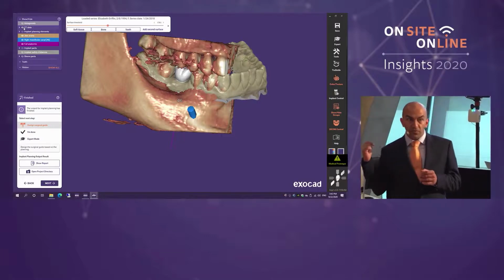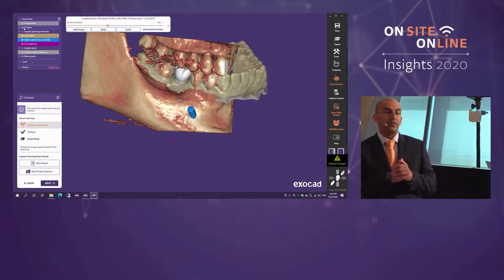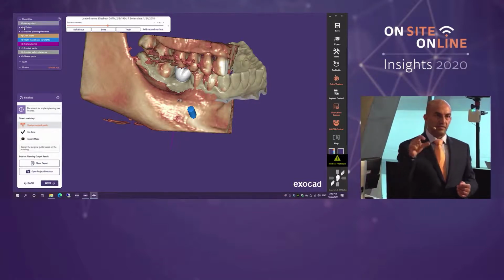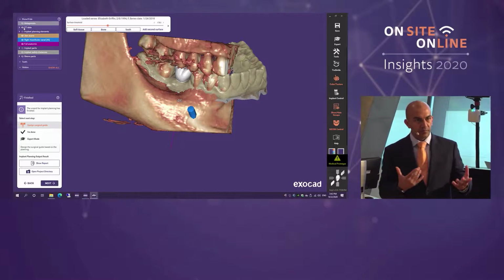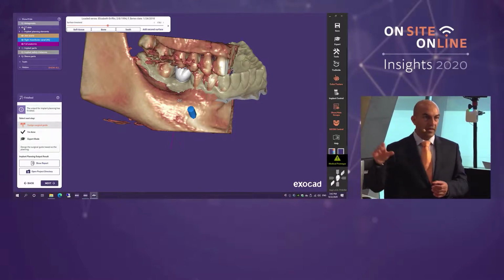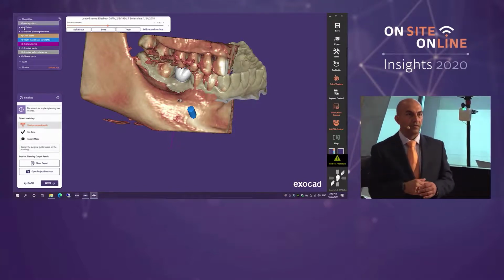And the reports would tell you as well. The reports would tell whoever's reading that report as to, did you follow the process? And you know, it's all about safety. It's about patient safety at the end of the day. So it's important that you don't click next, next, next and carry on. This requires precision. So yes, there is a way of zooming in and knowing that. If you come and see me at the end, we'll go back to that step and I'll show you again graphically.